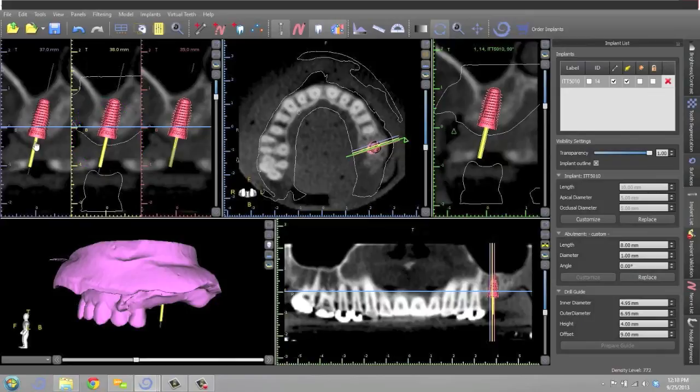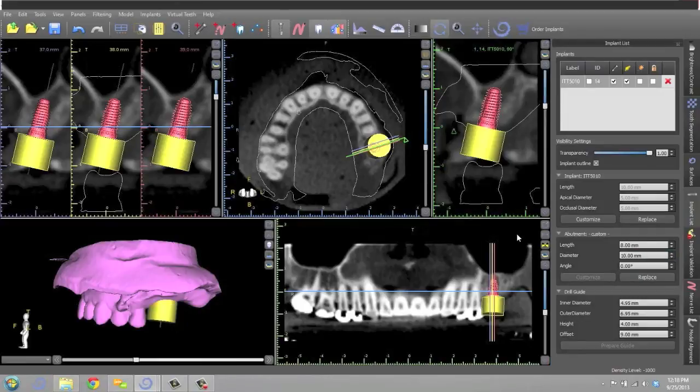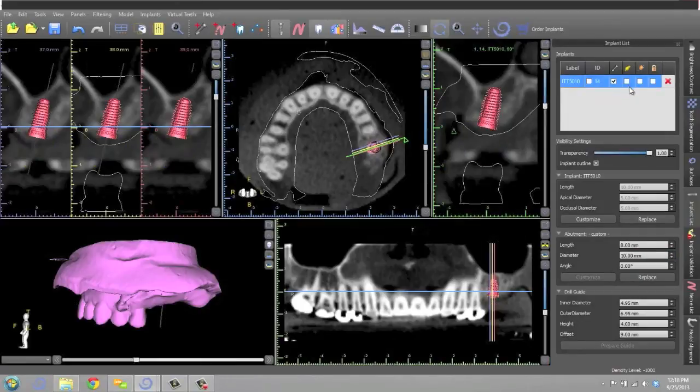You can see how there is a center line with the implant, but in some sections it may not show clearly, and so it's nice to have this center line. And you can make it as long as you want, and now you can see exactly the occlusal relationship. We'll change it back to 10. So I can make that go away.